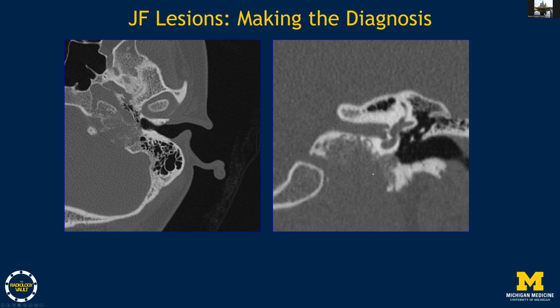It's centered in the jugular foramen, but it's not only in the jugular foramen. This could be picked up clinically as well. If someone looks in an ear, you can imagine an otolaryngologist looking down the barrel of the EAC. They see the tympanic membrane. They look very down low in the hypotympanum, and hey, there's something down there. They're getting a tip of the iceberg. They don't know how big this thing is, but this is the kind of thing you would see, and that might come to a temporal bone CT study. It would look something like this.